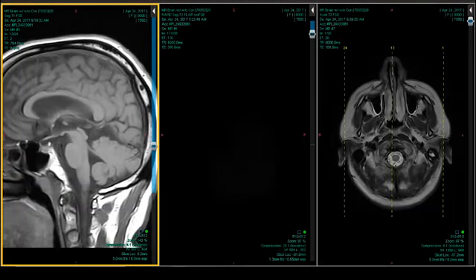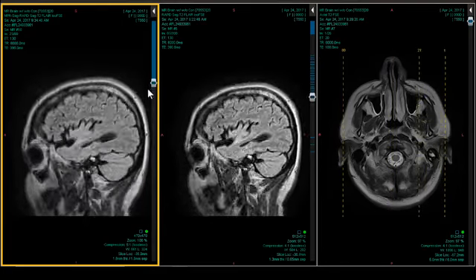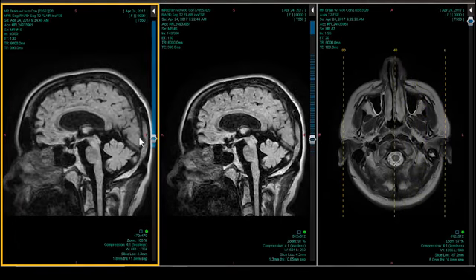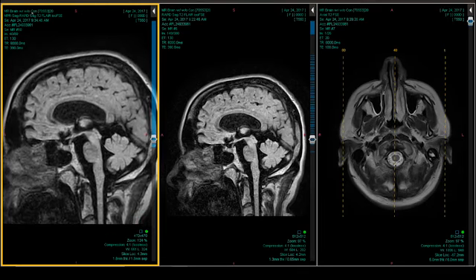Okay, so I'm going to throw up a sagittal just so we can get a good feel for the brain stem, the midbrain. I think I'll even throw up something with a little thinner slice, 1.6 millimeter, a 1.8 millimeter cut. You can see down in the right-hand corner, 1.8 millimeter separation means there's no overlap. So it looks like they used motion correction on this one because of the patient's tremor.